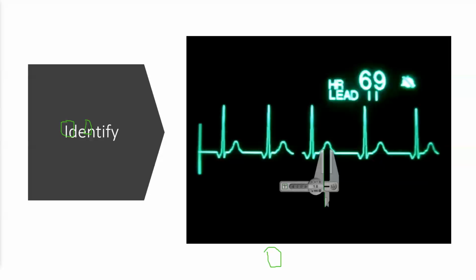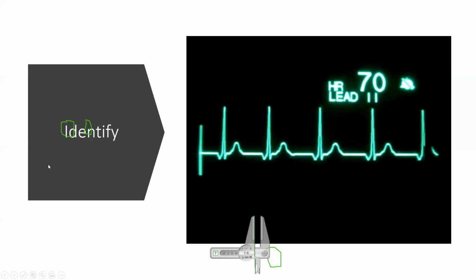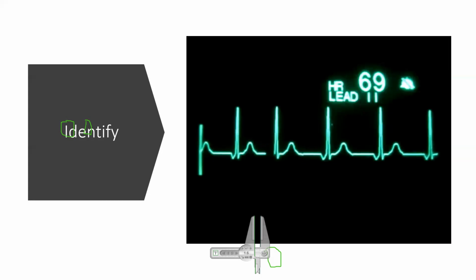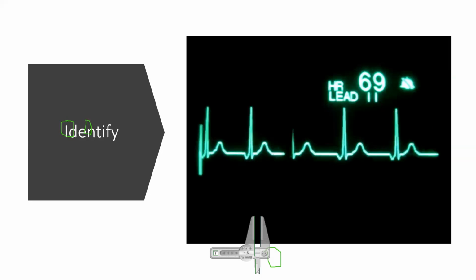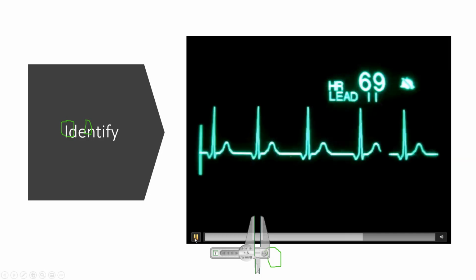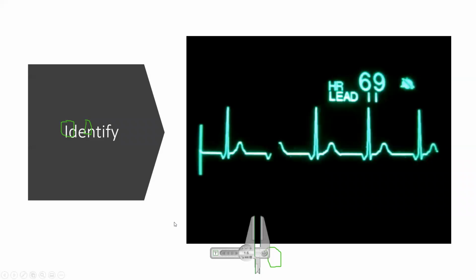Okay, let's go to the next one. Okay, could you please put in the chat what your diagnosis is?